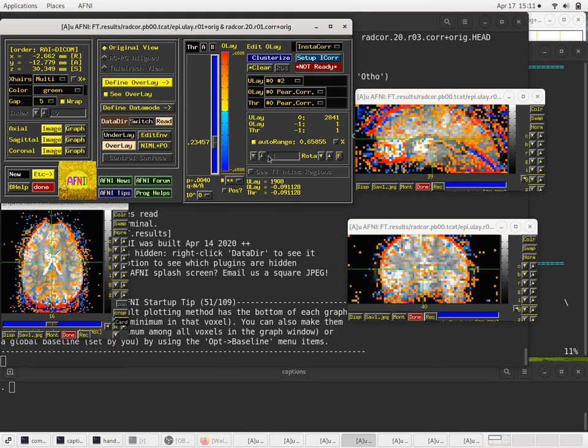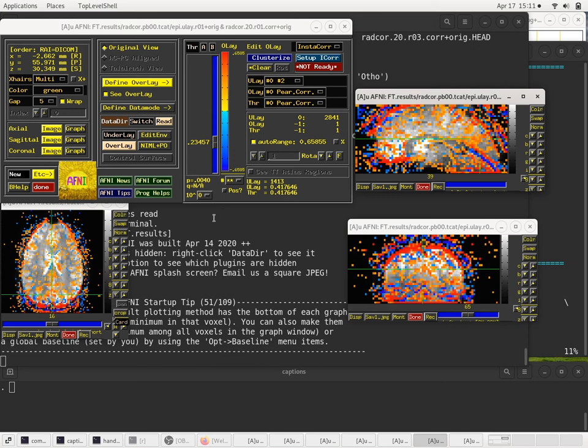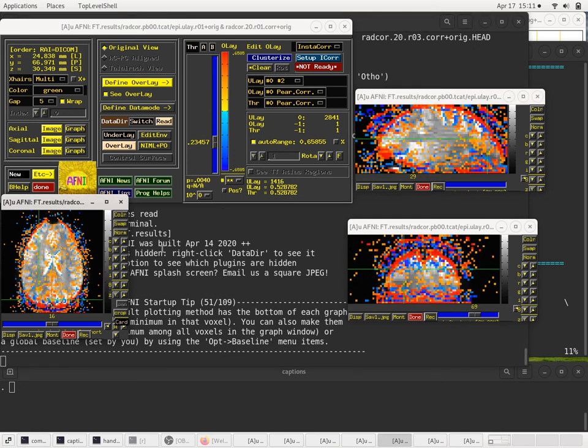Wonderful. So the values are correlations, and at each voxel we're basically computing a Gaussian blur and getting some sort of Gaussian weighted average. So at this voxel, say I'll just jump somewhere. Let me get off the midline. At this voxel here, we compute some Gaussian weighted average around it with a radius of 20 millimeters or so.